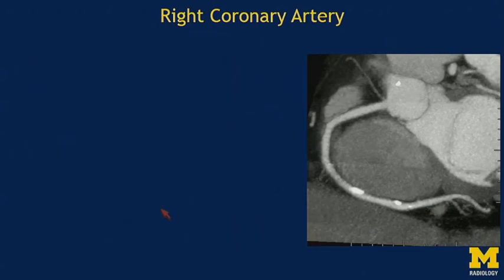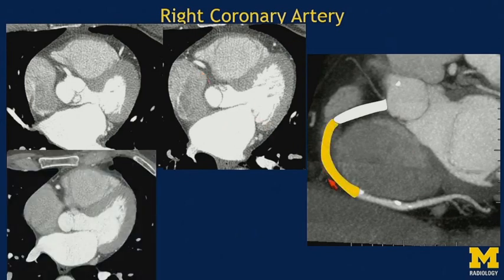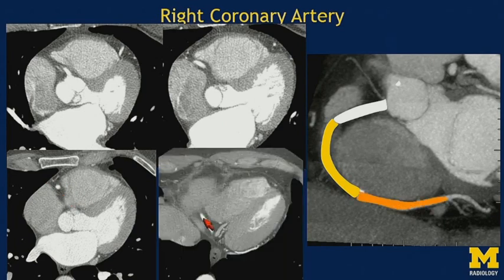How does it look on axial imaging? Well, one thing I find is in the RCA, you have very distinct regions. The first part is where it looks very horizontal. And if you're looking on axial images, you catch the vessel pretty much in long section. And then fortuitously, a significant portion of the RCA courses in a plane which is perpendicular to our axial images. So we get a very good assessment of the right coronary artery on simple axial images alone. And finally, again, it takes this horizontal bend, so again, we start catching the vessel in a longitudinal section.